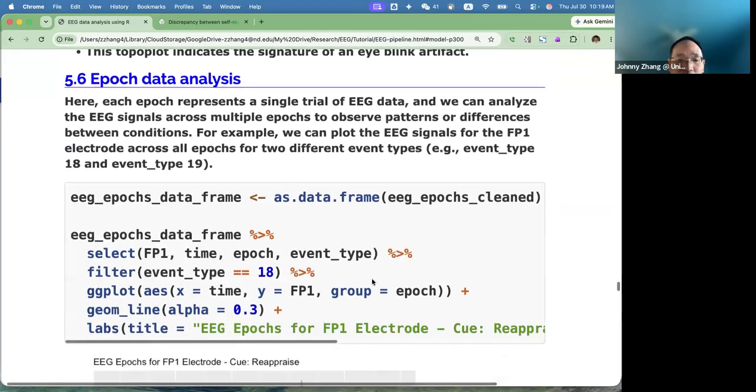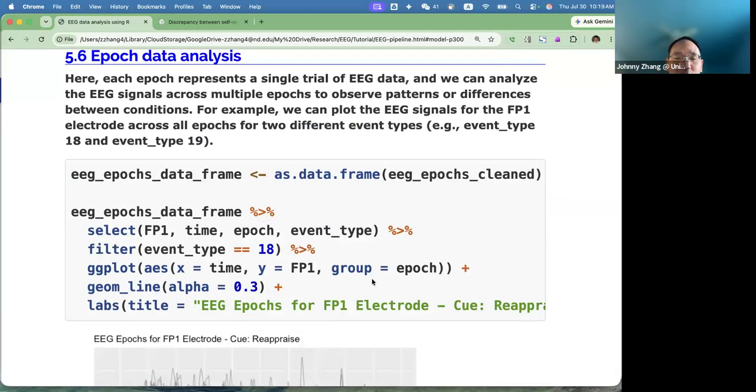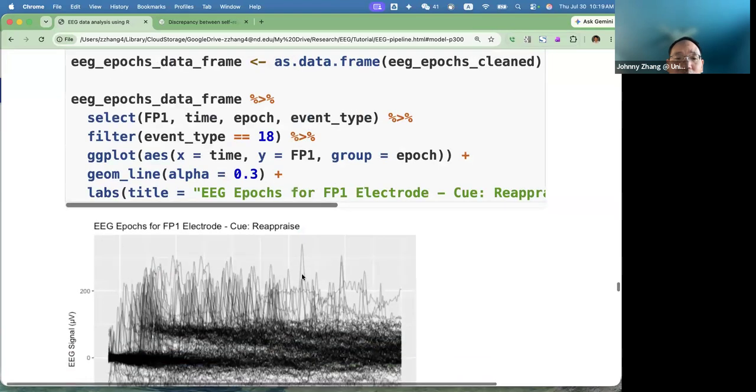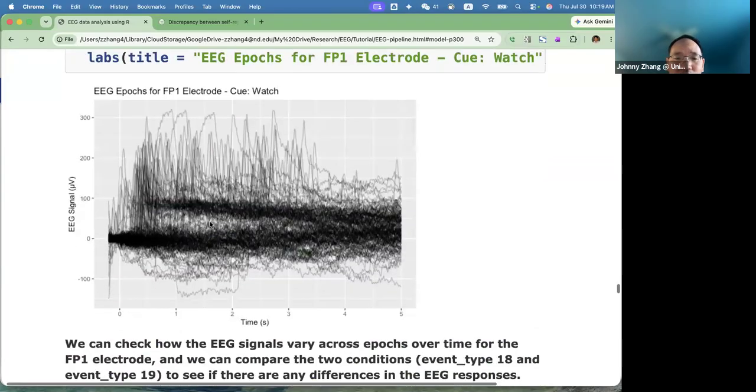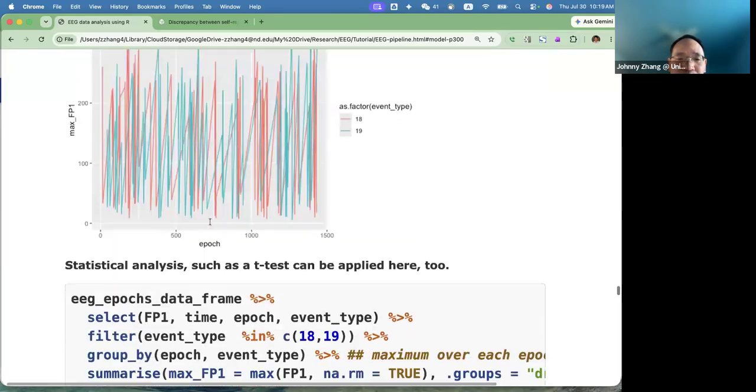And we can also do some data analysis. For example, we can do some statistical data analysis in addition to the visualizing earlier. So here, basically, is another plot. We don't have much time, so I'll do this very quickly. So those are just plots.